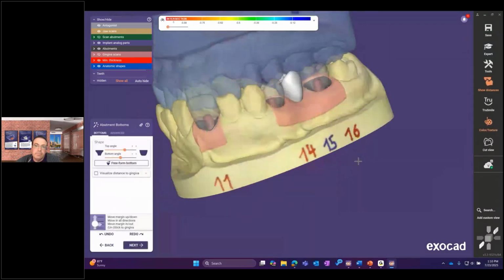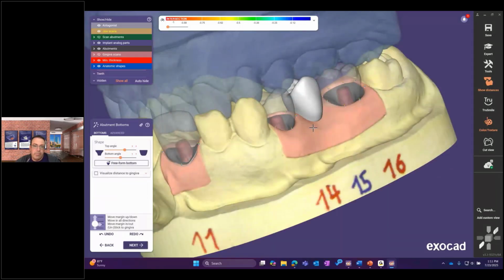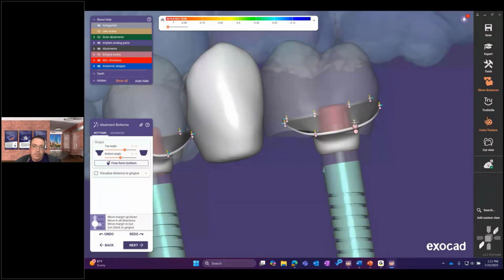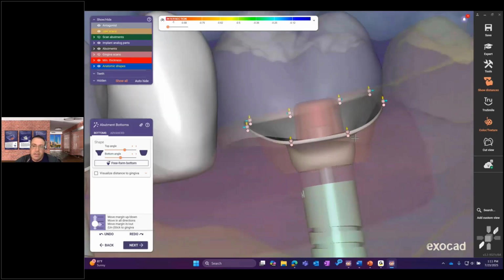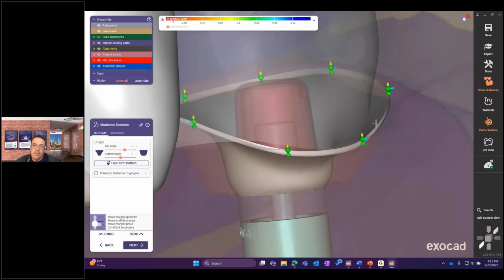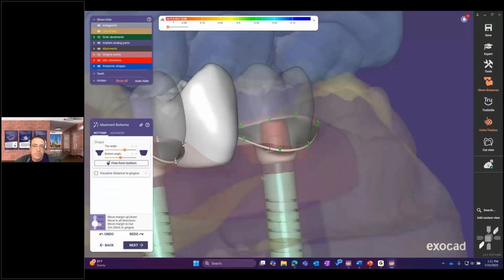Abutment bottom step. Let's turn off our model for a second. Not much new here, so just a quick reminder of the controls here. So minimize our jaw scan, opacity. So here, the control buttons are fixed to the gingiva. We kind of mentioned this on the bar case here, but if you hold down control and click that disc underneath, it unlocks everything. So now you can adjust the margin position and make that subgingival if you need to.